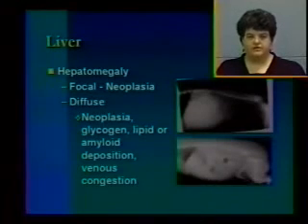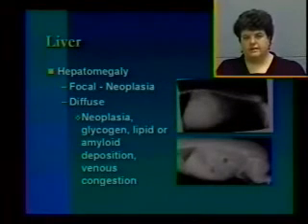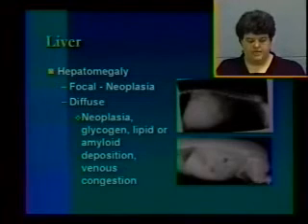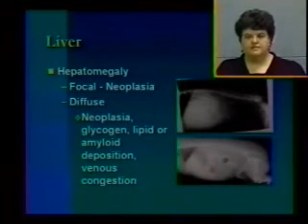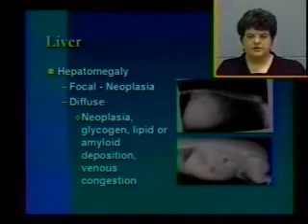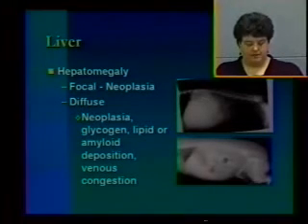On the other hand, the liver, if it gets too big, is going to caudally displace the gastric axis. Focally, as in the top one, you can see that there's actually caudal and dorsal displacement of the stomach, indicated by the curved line. And this is most commonly going to be seen with a focal mass, either an abscess, a tumor, etc. It's important to know the common tumors that occur in the liver, a lot of which are benign, so that's something you need to think about.